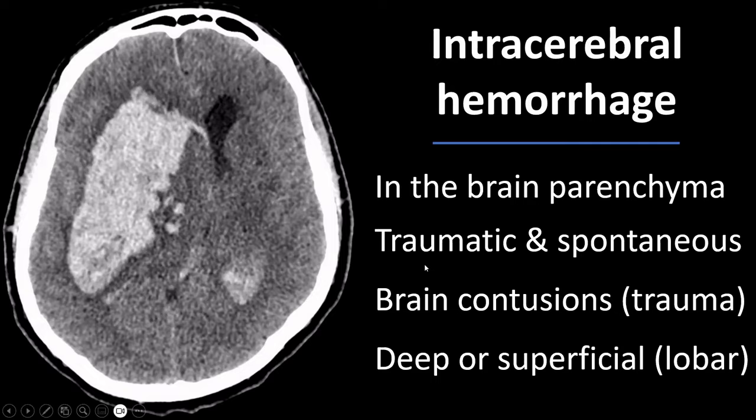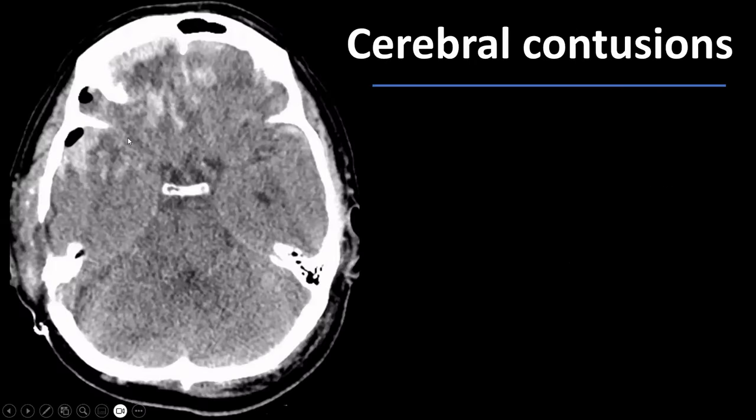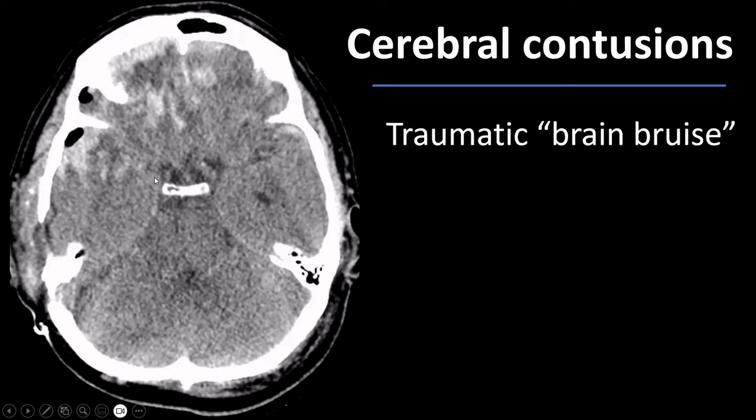And as said, brain contusions are seen after trauma. This is what brain contusions typically look like. We see these very small patchy hemorrhages, somewhat surrounded by edema, located at the base of the frontal lobes and also anteriorly in the temporal lobes on both sides. There is associated subarachnoid blood, some subdural blood. I admit it is not so easy on these images, so just believe me.